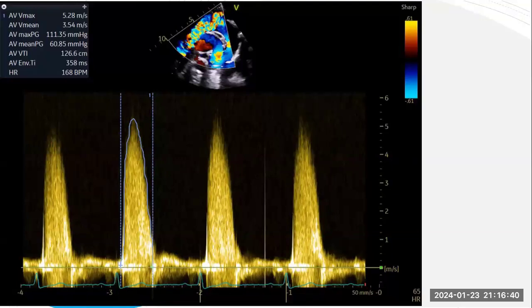So if you want to comment, start with bicuspid aortic valve, moderately severe or severe aortic stenosis based on the sheet, and after that comment on the LVH, that the LV is thickened, hypertrophied, and at the end, if there is one more, you can comment on anything else like the LV function, LV size, whatever.